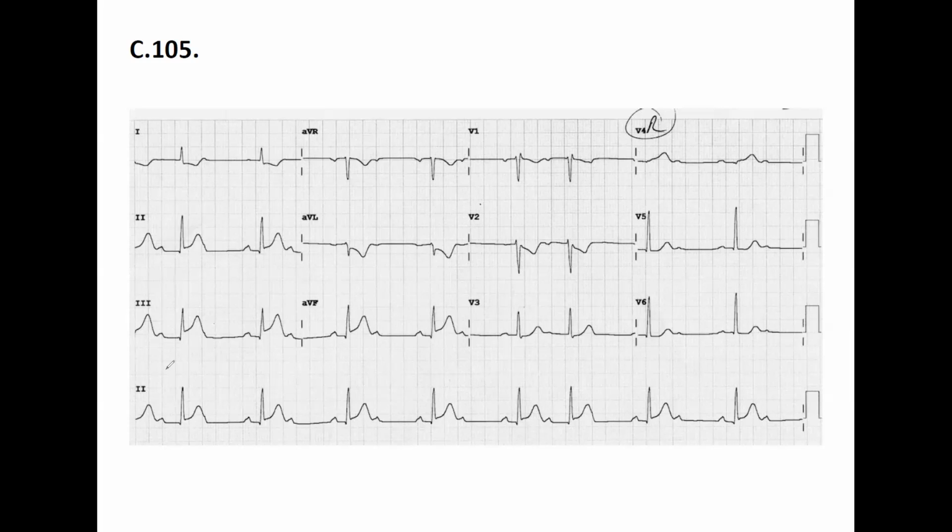You mentioned that you do see a one-to-one conduction. I have a doubt about it. First of all, that's a P wave. That's a P wave. That's a P wave. Here you can see immediately that this one is not conducted. Conducted, not conducted. So again, you do see some unconducted beats, and this makes it arrhythmic. Inside the T wave there's a little notch. That could be a P wave. So it is not one-to-one.